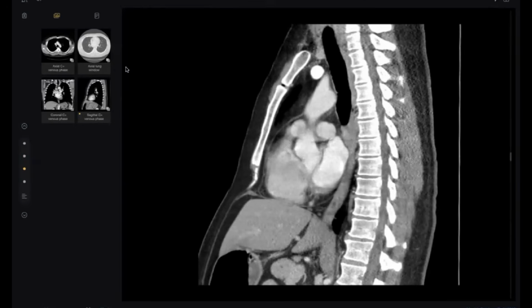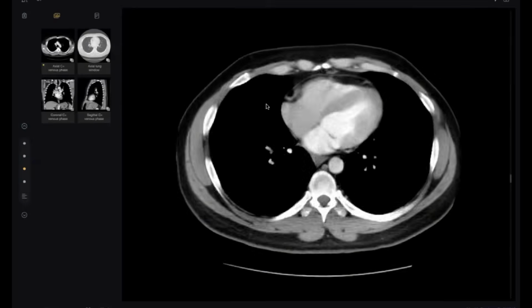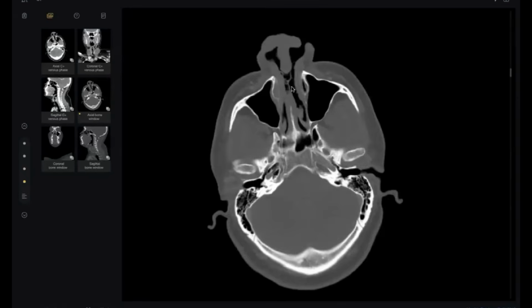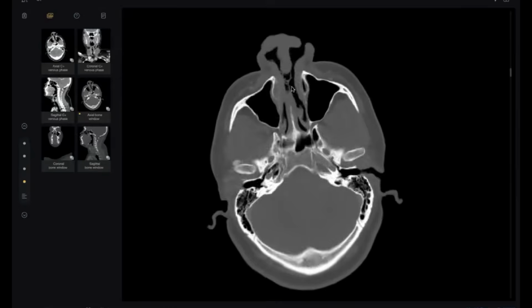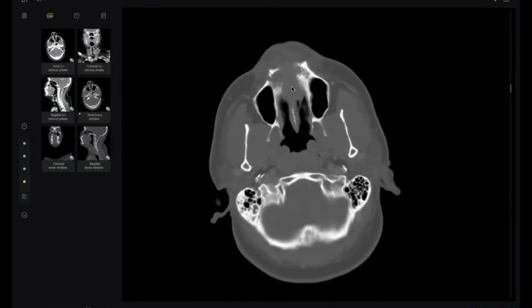This is not the common picture of TB. The spine is very normal, very clear. Did you see before any TB causing nasal septum perforation? If you told me this is maybe Wegener, it is acceptable. This is cocaine addiction, acceptable. Did you see before any TB causing erosion like this?